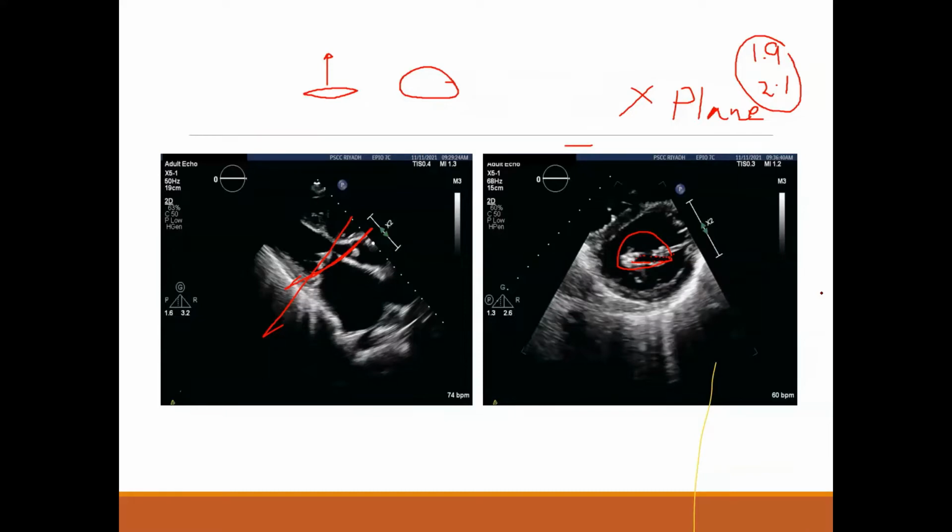You don't see where the area starts and ends. It's difficult in aortic stenosis. You can try it, but usually you will fail, unless you have a bicuspid valve, maybe yes. In degenerative aortic stenosis it's very hard to planimetrize. Like in mitral stenosis, in most cases you can manage to get an accurate planimetrized area.